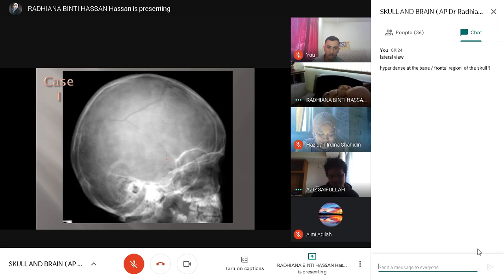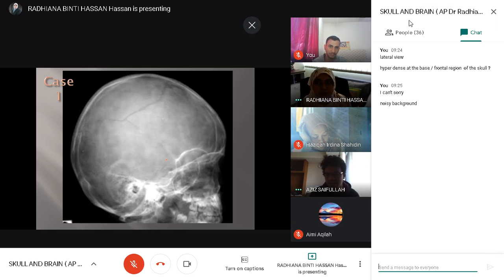Okay, carry on. Ibrahim, you want to add on? Hyperdense at the base frontal region of the skull. Okay. Anybody else want to say something about this image?